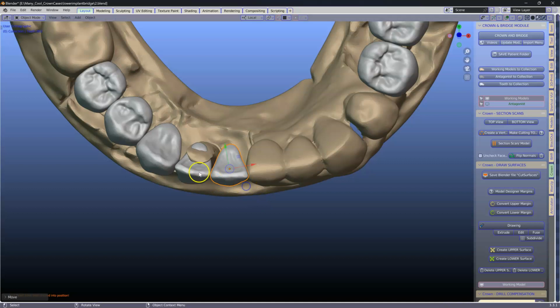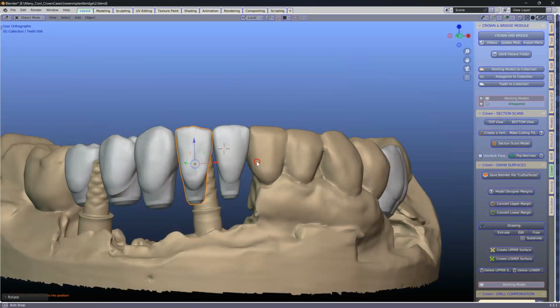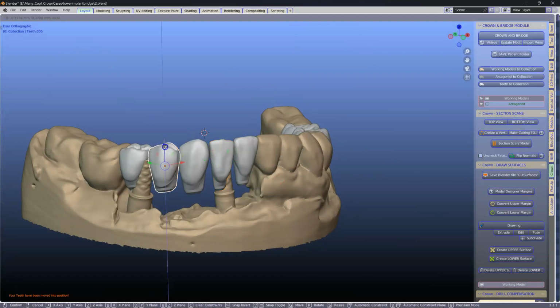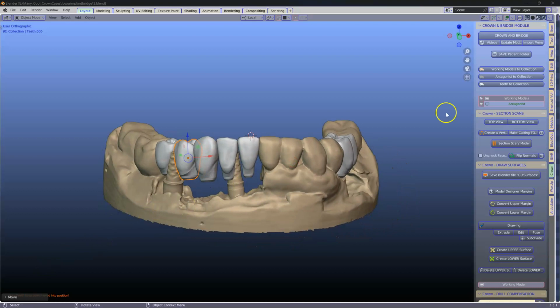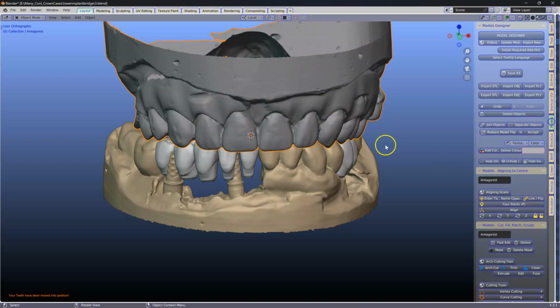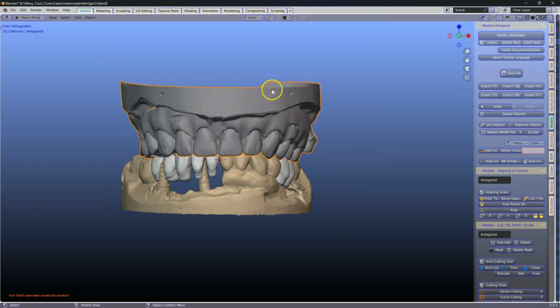Okay, so this will take a little bit of practice to work in 3D space. It's not that easy when you first start, but that seems to be okay. I'm going to be using the articulator to grind in the bite. Alright, let's have a look at the antagonist. So this is going to change names in the articulator. So just remember that. Okay, so mind you, we don't actually need the upper model. Yeah, we'll need it for visualization only.